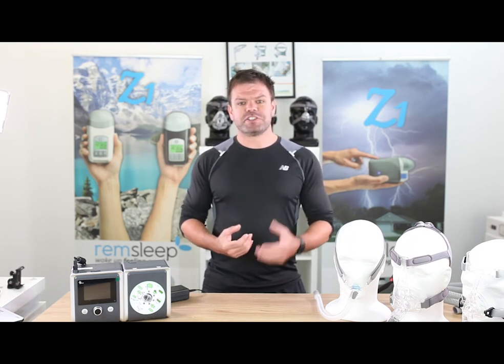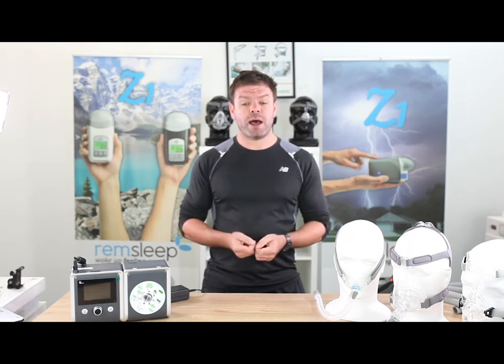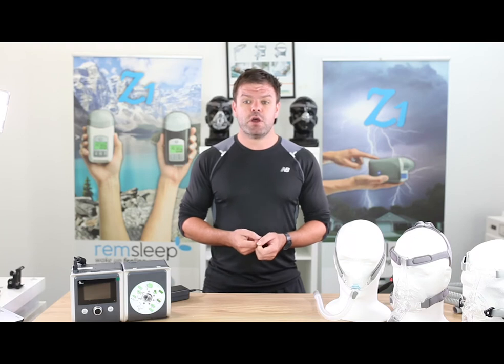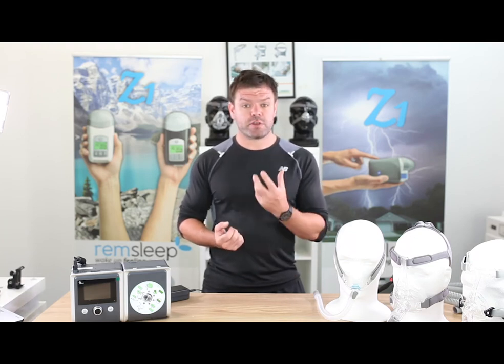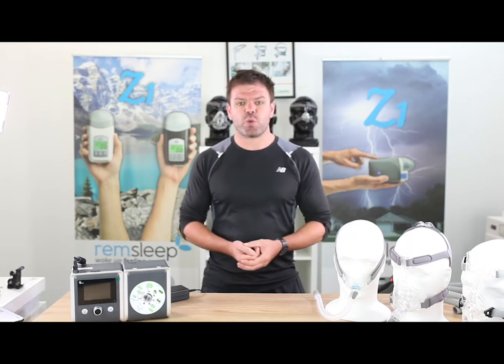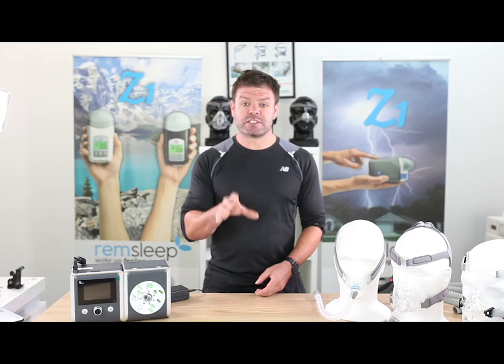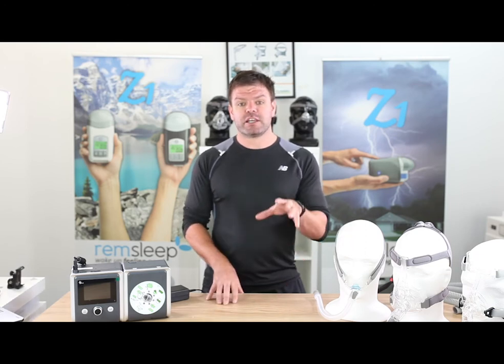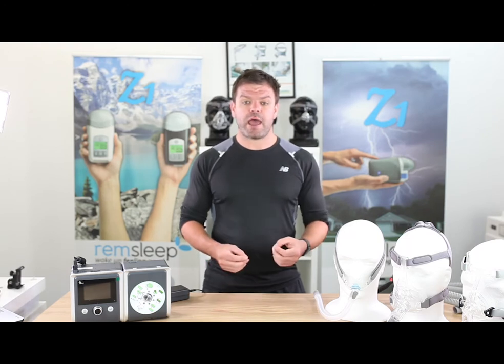If your leak rates are over 60 litres per minute, it's a little bit high and you may need to look at readjusting your mask, tightening it a little bit with the straps, or just repositioning it a bit. Over time, you'll need to replace some components like the cushion and the straps as they stretch and wear. So let's now go and look at a real live example on how we can use the sleep therapy data to adjust our CPAP settings to make our therapy more comfortable and more effective.